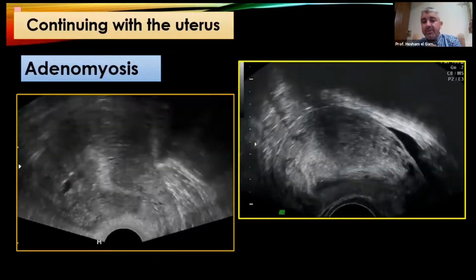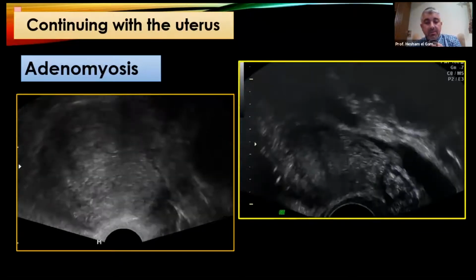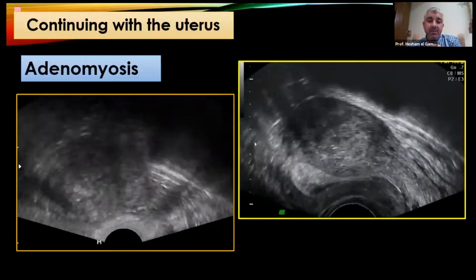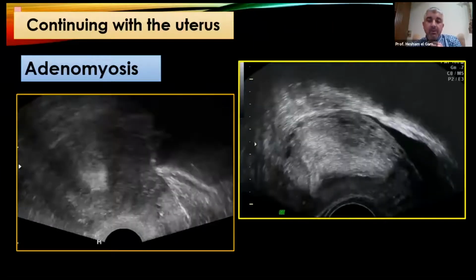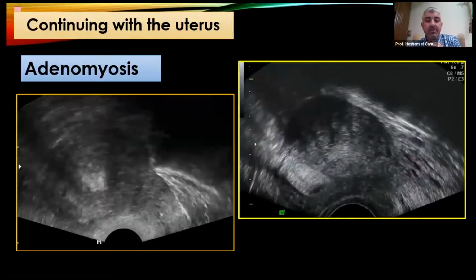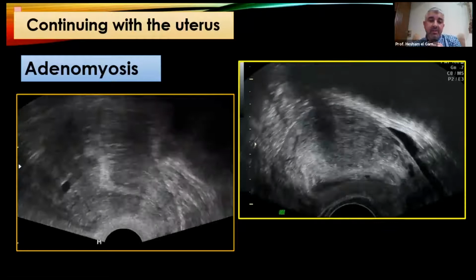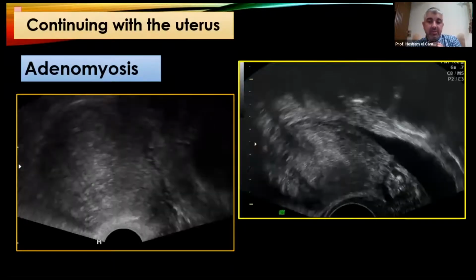Moving on with adenomyosis that affects the uterus. We all know what adenomyosis looks like now. There have been a lot of studies explaining the different signs and the power of each sign in order to diagnose: asymmetrical enlargement with heterogeneous myometrium, subendometrial non-vascular cysts, sun-ray appearance. All this indicates that what you are seeing is adenomyosis.